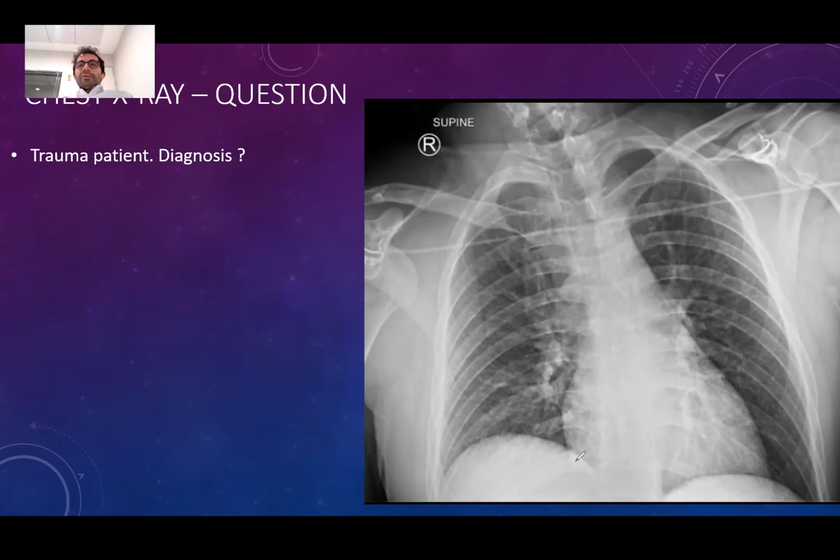Yeah, good catch. There is a clavicle fracture on the right. You mean this one, right? It's not displaced, so probably it can be because of the angle, but yeah, maybe here. The lungs are okay, right? I'm not seeing anything. The heart is, yeah, a little bit big.